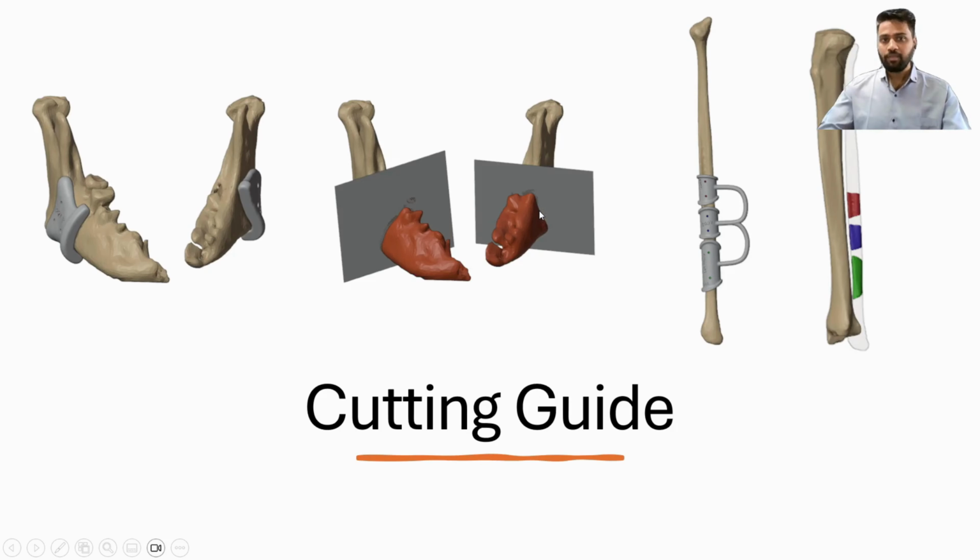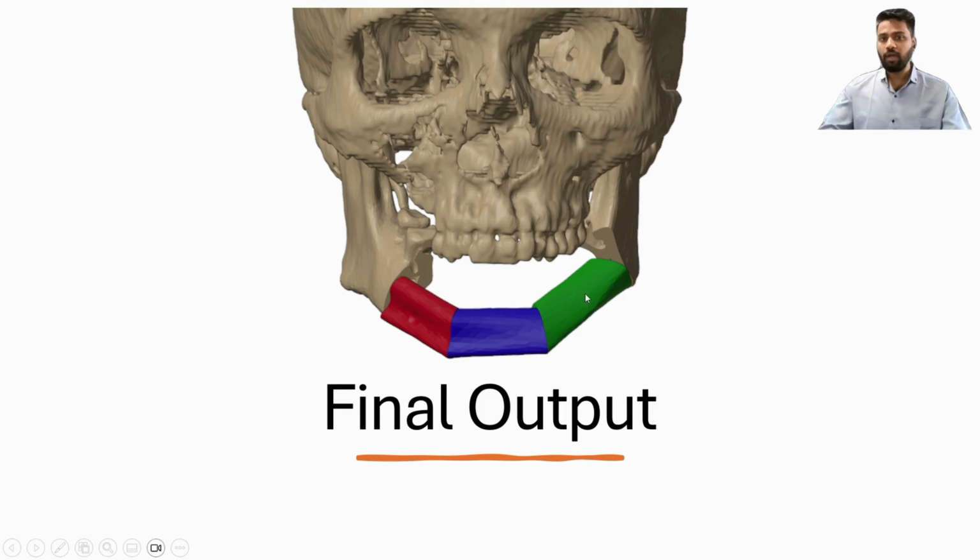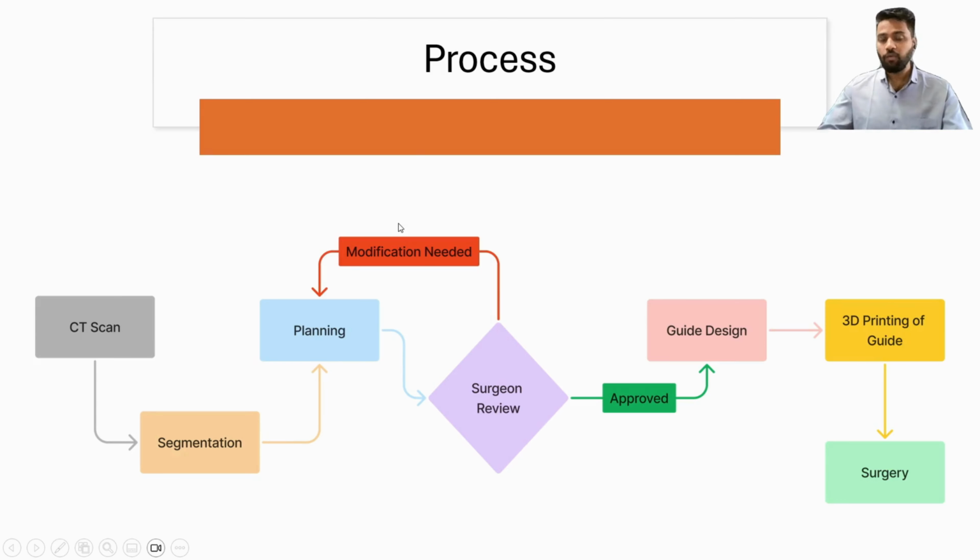the patient. Once this process has been completed, the guides will be created: the mandible guide and the fibula cutting guide, to achieve the same planning during the surgery. And the final output will look like this. So what I want to discuss is the process.